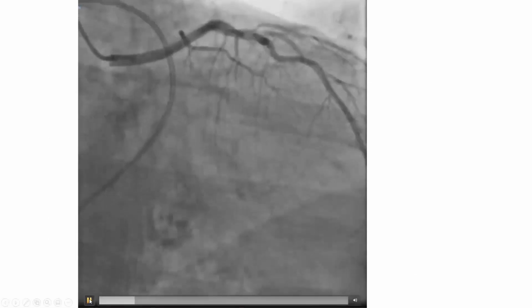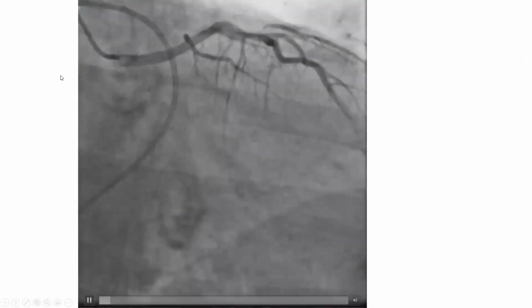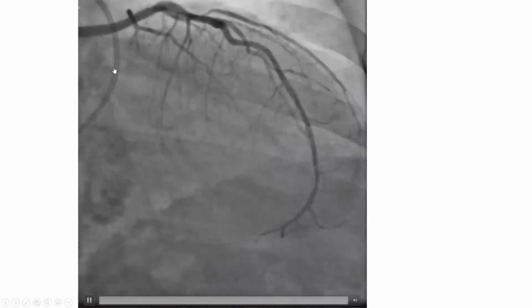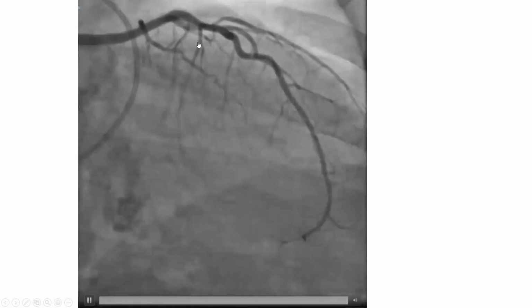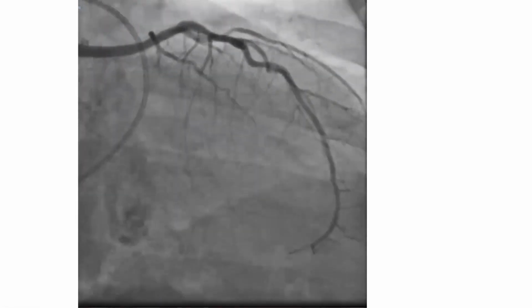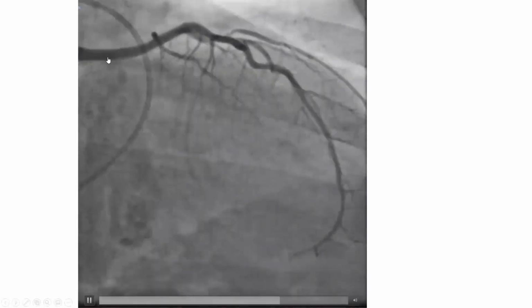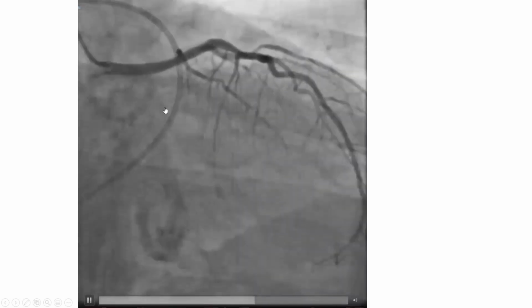This is another case. This one is extremely important for general cardiology board. I guarantee you that you will have that image on your imaging section of cardiology board. So you take your left coronary angiogram and you see a very long left main, okay? What is your immediate reflex? You should always know that. Very long left main, my immediate reflex is that there is no circumflex that I'm seeing. It's an anomalous left circumflex.